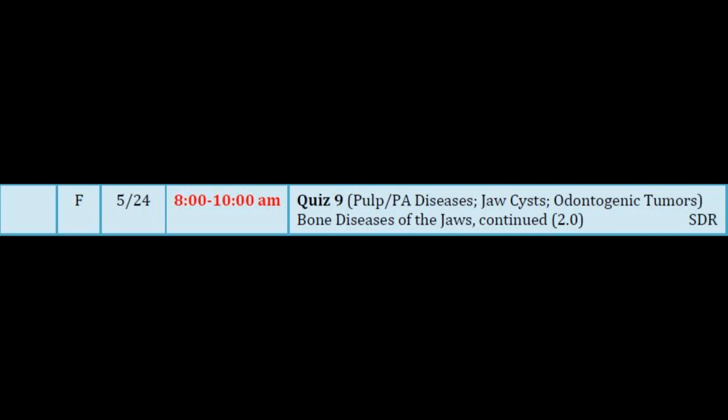A little easier to see. This was a 16-year-old. She was only aware of the lesion for 5 months, but by the time it was detected, it was radiographically 4 centimeters. Bony hard expansion, posterior maxilla. Lucent, opaque, or mixed? Mixed.